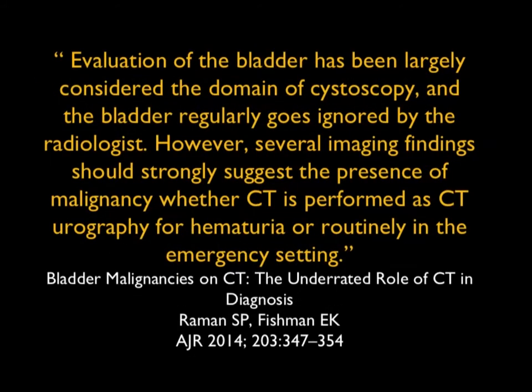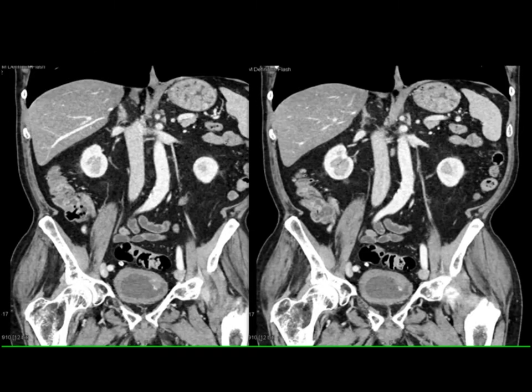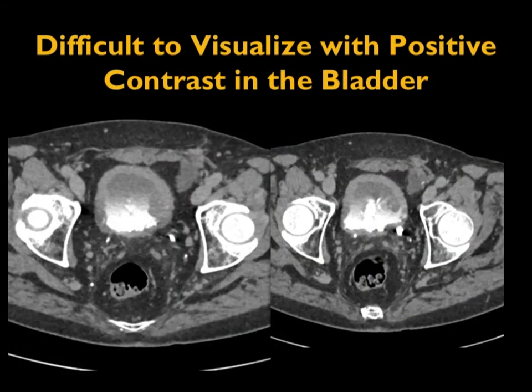Now, it's interesting that in the old days we did CT a lot of the time for bladder staging. Now we don't with bladder cancers, but you can see why CT would be so good in this mode. Let me just finish up with a few more bladder cancers in terms of tumor. Here's a diffuse thickening of the bladder wall, which could simply be inflammatory. It's difficult to be specific, but then you see a polypoid lesion at about 3 o'clock, which was a bladder cancer.